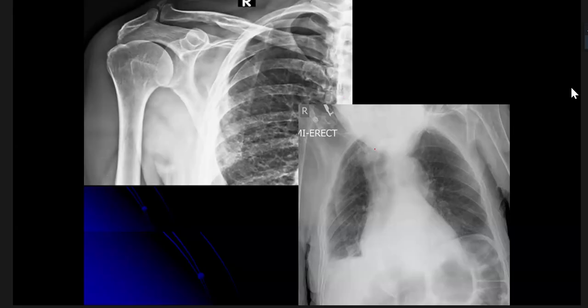Very good. So are you seeing this part? I think the line is ending here. Here, I can see the line is going through, all the way to this. Do you think the pleural line would be this thick and big if it was a pneumothorax? And what is the most important feature of pneumothorax? What do we see after the pleural line?